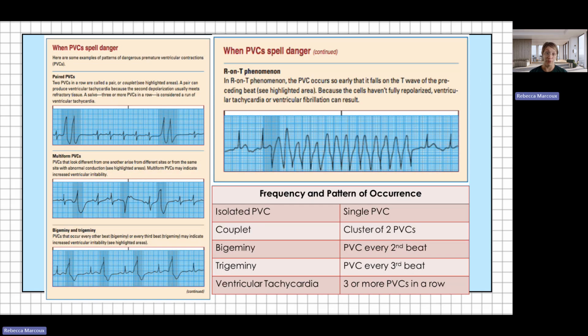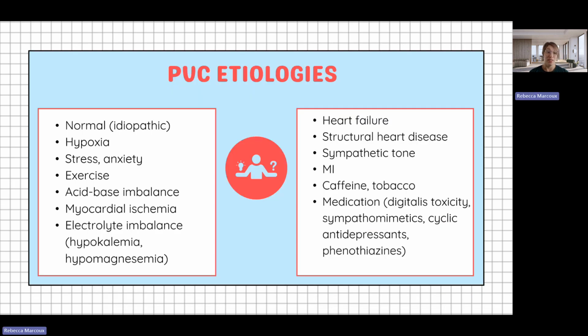Oh, and multiform. We do start getting more concerned if there's multiple foci that these are coming from. Etiologies, there's so many things. As always with all of our rhythms, some patients are going to have PVCs. Normally, again, we generally aren't concerned with them unless they're happening frequently.